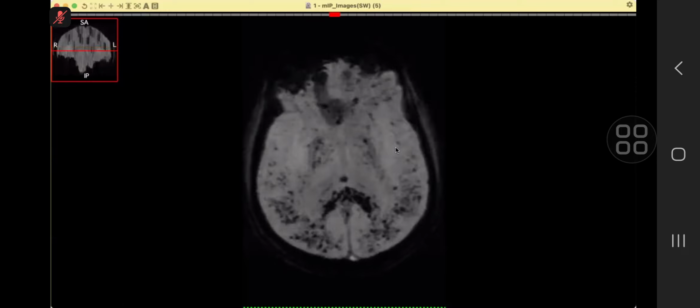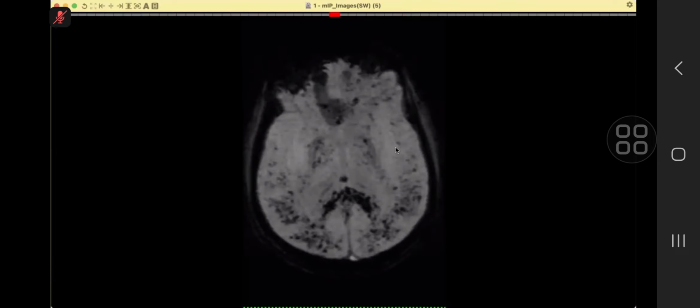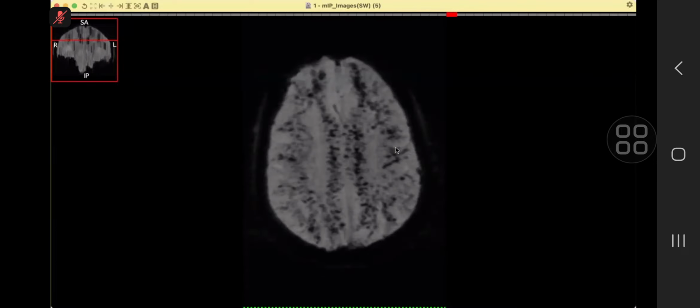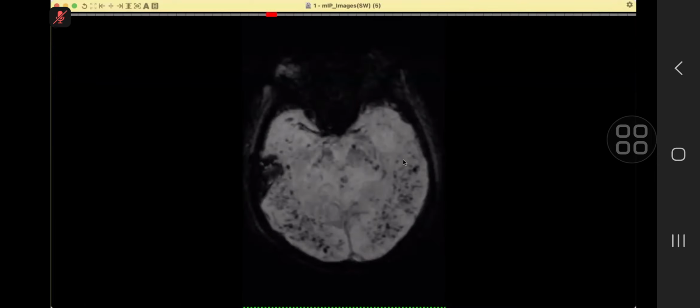So what has happened? Sir, I would like to see if there is any history of trauma, which might represent diffuse axonal injury, but otherwise these are microhemorrhages. Yes, sir, we stop here. Okay, thank you. Chat, anybody in the chat? The patient is 23. PRES, vasculitis, fat embolism. Lovely. Somebody has got it.